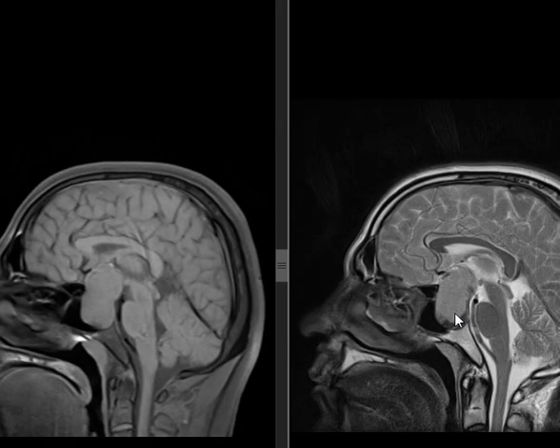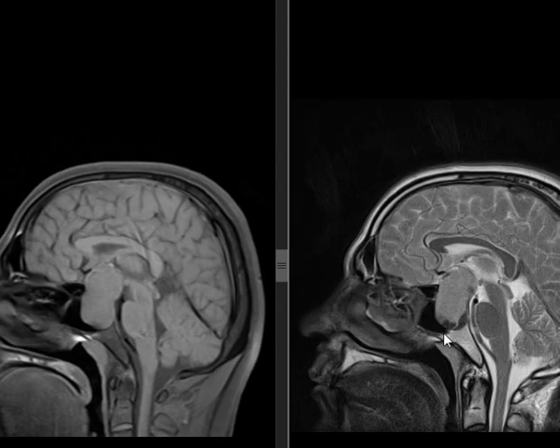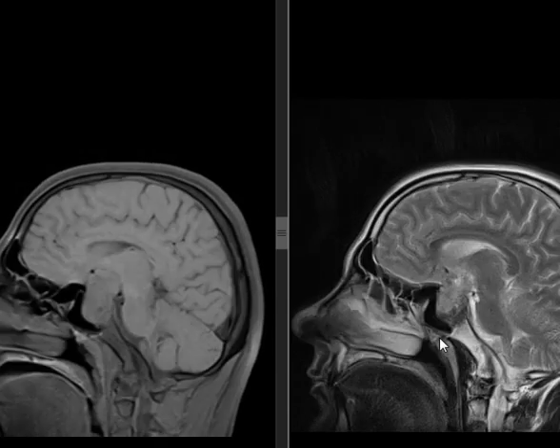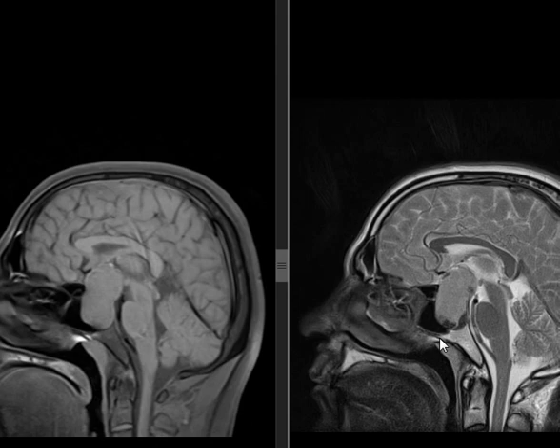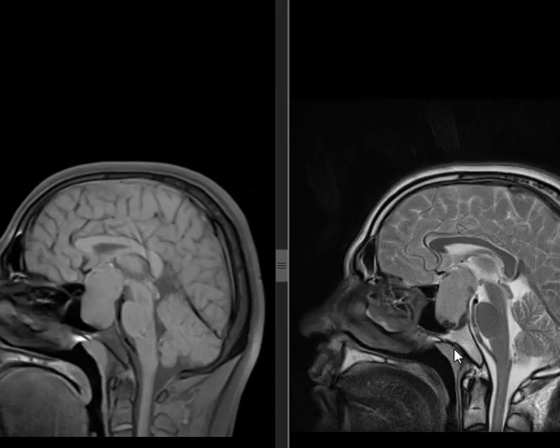So, what would you do next? Contrast. Why? For enhancement and invasion of the surrounding. Does it enhance or not enhance? What's the difference? If this lesion enhanced or does not enhance, does it make any difference to you? Cystic lesions don't enhance. Is this cystic? No. You don't need contrast to say this is soft tissue, not cystic. All you need is T1 and T2, that's it.